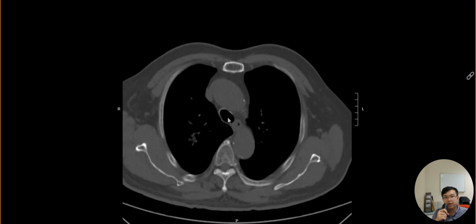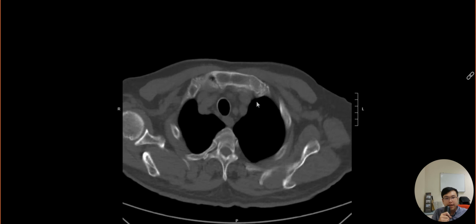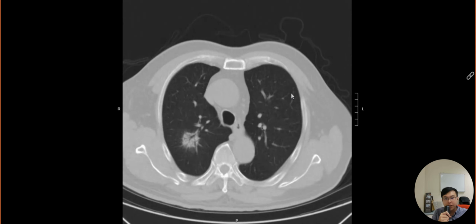Apart from doing a dedicated contrast CT thorax, abdomen, and pelvis for proper staging of this lesion, eventually we will also need a tissue diagnosis. Of course, nowadays we also have some blood tests which aid the diagnosis.